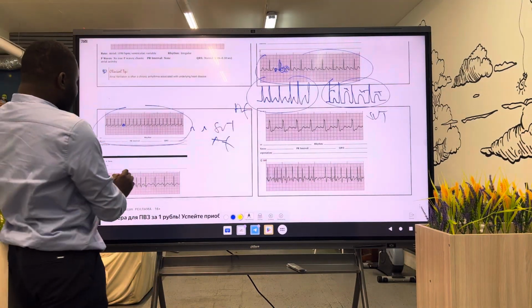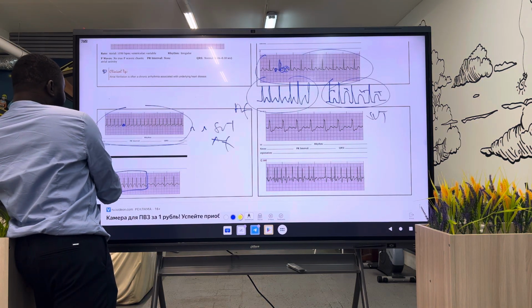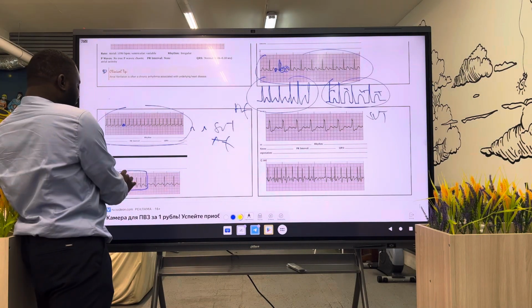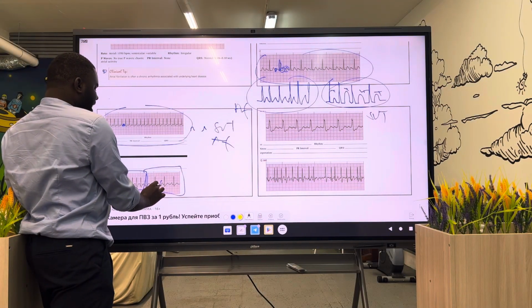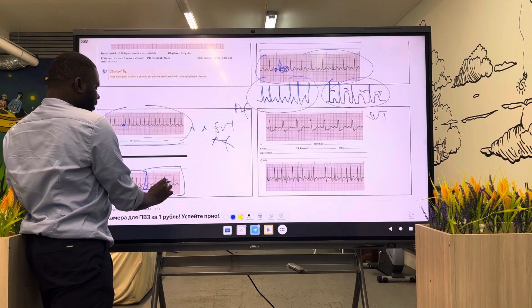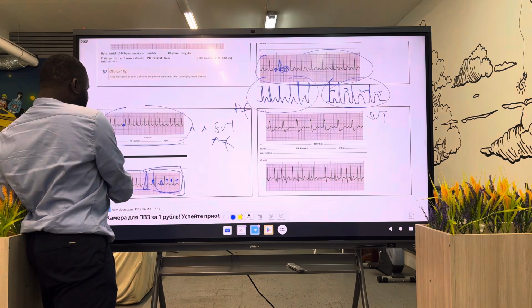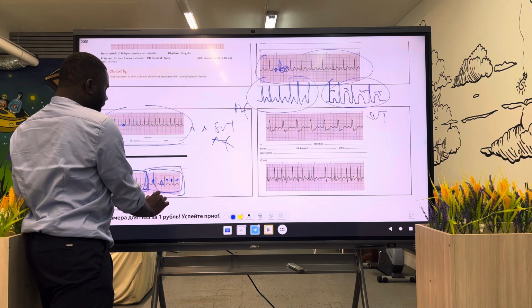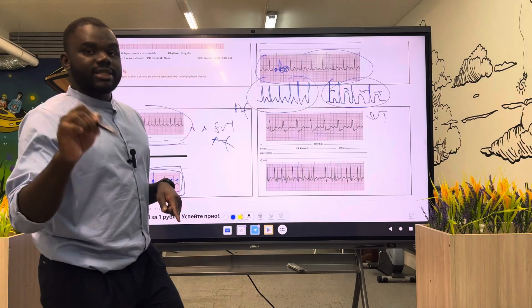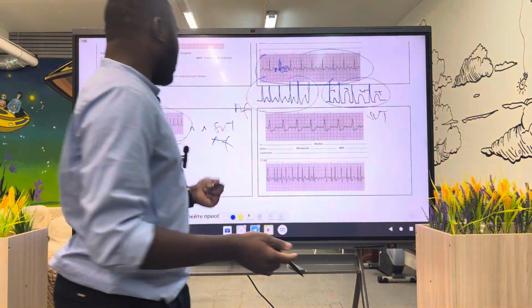Now we have something interesting here. Here we have a case of T wave in between RR interval, non-sinus, regular, and then here we have what? Normal ECG, because here we have P, here we have T, we have P, we have T, and here we have P also, right? So this is a normal ECG here, and then this is a what? SVT. So SVT plus normal is called what? Paroxysmal SVT, sudden onset of SVT. This is known as paroxysmal.